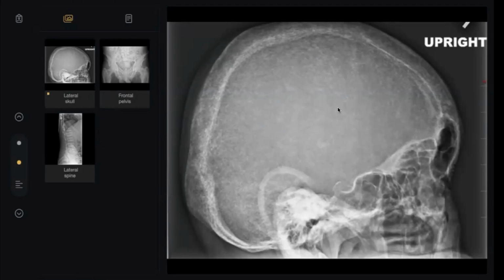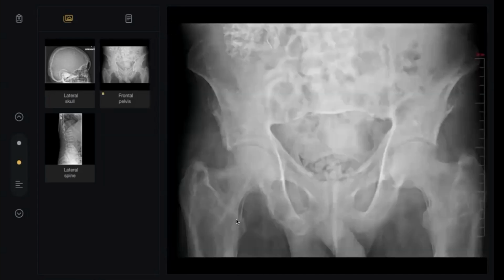Is this the cotton wool, doctor? This is not a cotton wool. Doctor, look again. And don't worry, by the way. Is the cortex here thick or not? No, it is not thick. So it is not Paget disease. We exclude it.